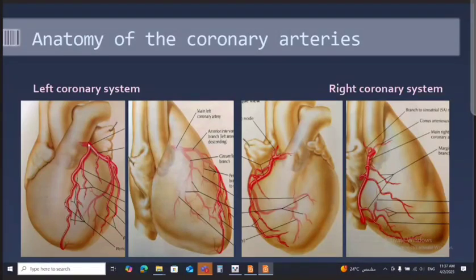And so we have the left anterior descending artery supplying the diagonal branches and septal perforators. The left circumflex artery supplies the obtuse marginal branches, sometimes supplies the high lateral, and ends by giving the posterolateral branch at the inferior surface of the left ventricle. Sometimes the left main trunk, instead of bifurcating into LAD and LCX, trifurcates into the LAD, ramus intermedius, and LCX. The ramus artery runs at the anterolateral wall of the left ventricle and supplies it, taking the role of the first diagonal or first OM artery.